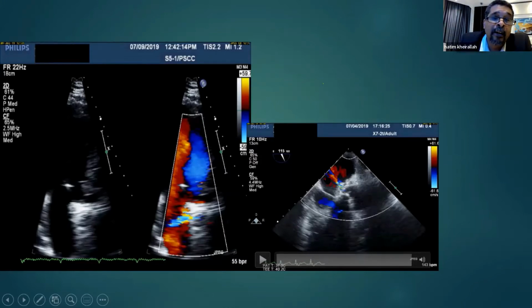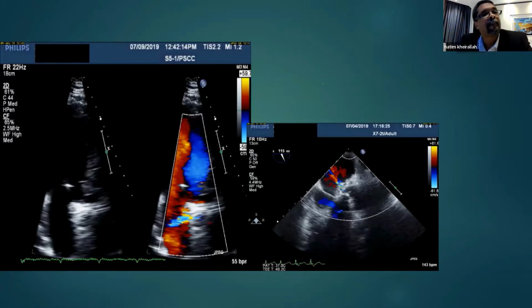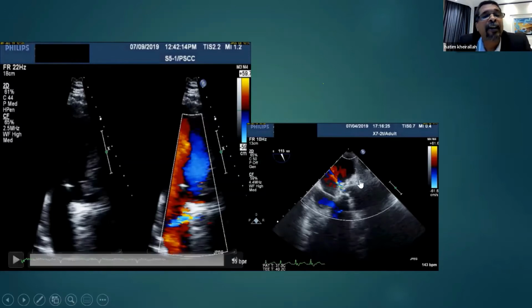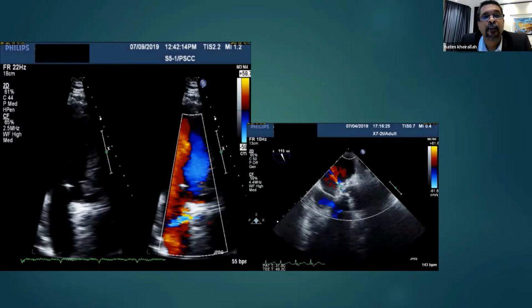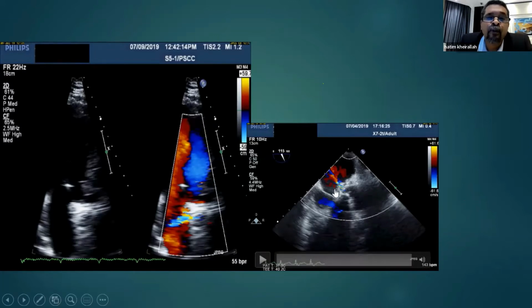There is no color that transects the boundaries going into the other chamber. That is if there is sinus aneurysm without rupture. But if there is rupture, you are going to see exactly this flow. The only additional thing that differentiates between the two is the aneurysmal dilatation. You will see aneurysmal dilatation and rupture.